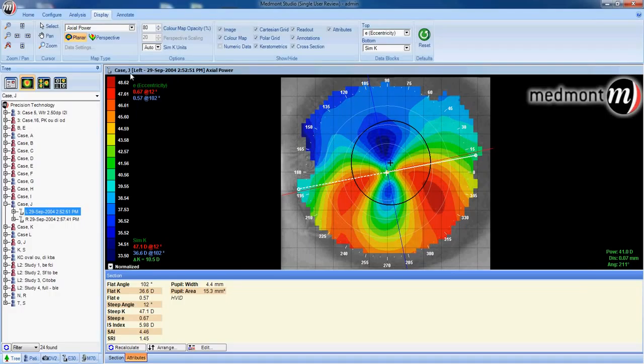We can look at the eccentricity values. When dealing with diseased eyes, they tend to have higher eccentricity values. Normal eccentricity is 0.65. This patient is very close to norm in terms of eccentricity, but certainly abnormal in terms of corneal astigmatism and against the rule, along with the appearance of the map showing the kissing doves or butterfly wings, as pellucid is often described in corneal topography, would indicate this is a diseased eye.